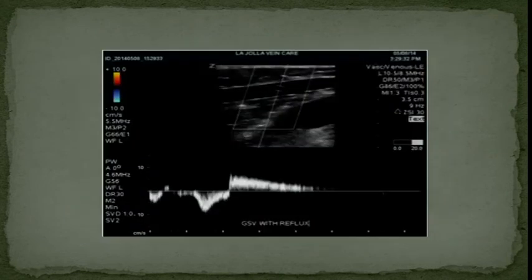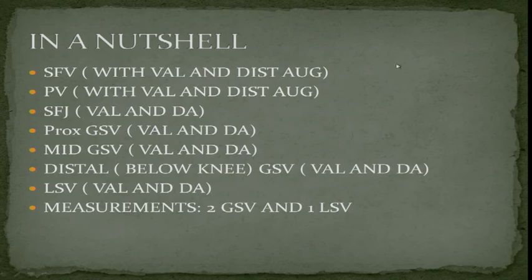All right. Easy peasy. Is there reflux? How many seconds if this is a second marker? 1, 2, 2.5. Severe. Correct. So this is just in a nutshell what we need to do.